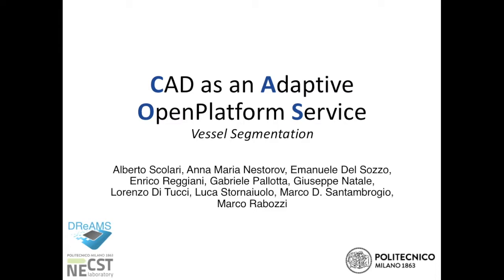In this video, we will see an example of usage of the CAOS framework with a demo application regarding vessel segmentation.